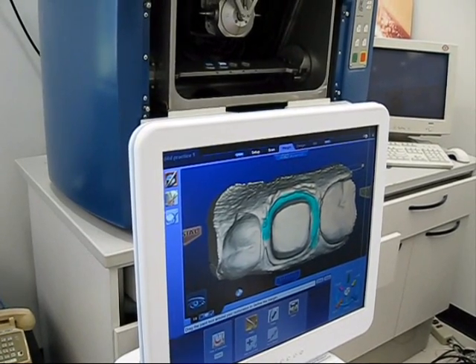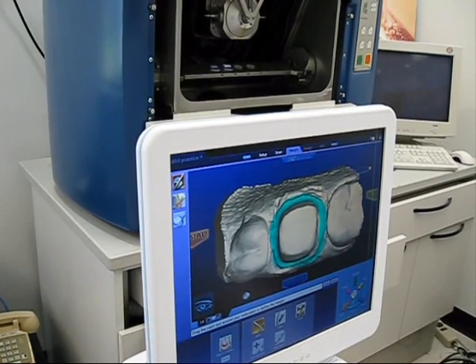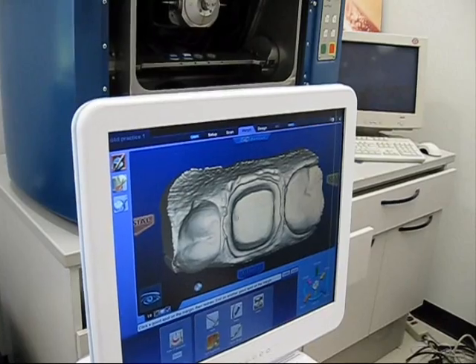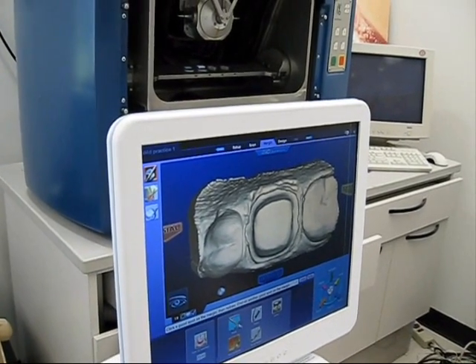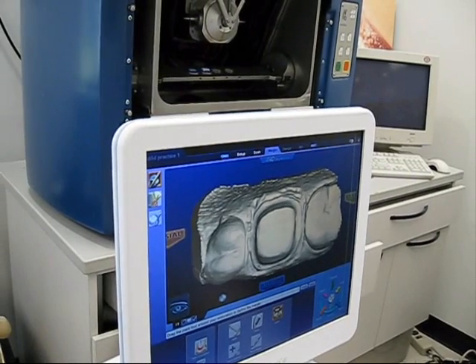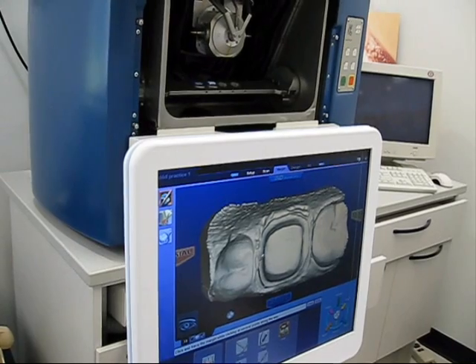Well, how exact is that, though? Well, I guess it depends on the user. Garbage in, garbage out. Absolutely. Here you obviously have to correct some areas. So some people like to paint. The lasso works better in my hands. That's interesting. There's a bunch of tools to figure out how you can do this.